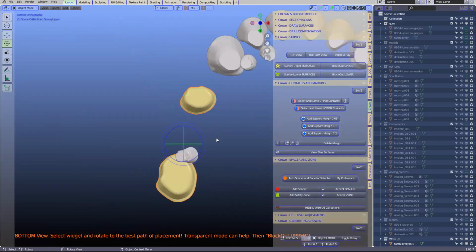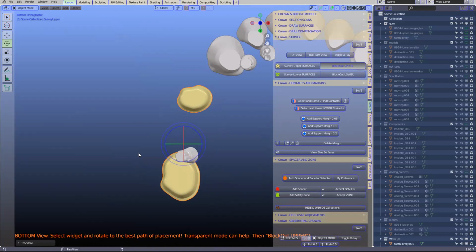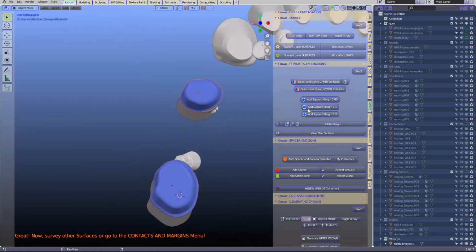Survey. Look at it. Like that. Block it out. Okay, margins for these two.